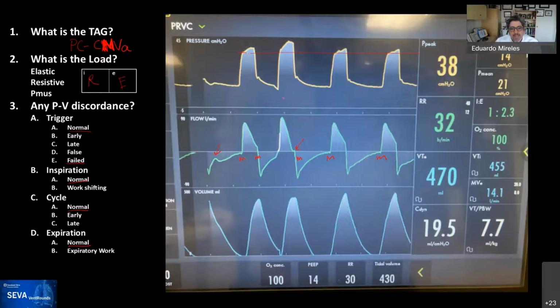However, there is this patient triggered breath, and you recognize it not only by the deep inspiratory pressure, but also by the changing color right here, and it tells us that it's a flow triggered breath. But you will recognize that the pressure is a little bit higher than the prior breath, without any good reason. The last breath's tidal volume was not below target. It simply gets a higher pressure than the prior one.